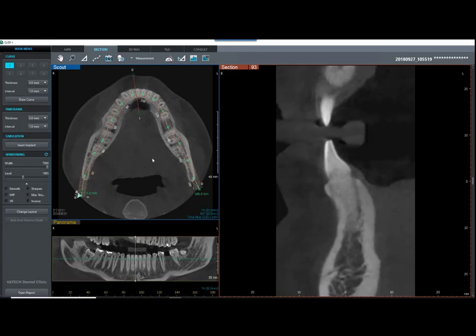All right. So Jim, that reconstructed pan in the lower left panel there, that looks a little bit thin. How can we change that? And can we change it in the settings as well?